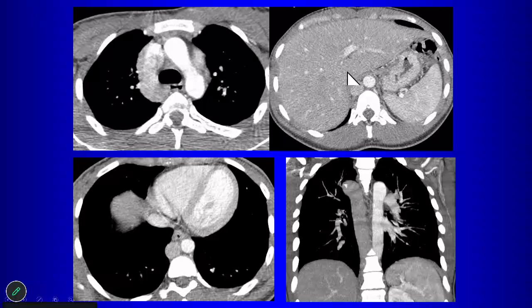So there's no intrahepatic inferior vena cava, right? So embryologically, this represents the azygos vein, which is carrying all of the blood flow from the lower part of the body, and that dilates, comes all the way up and drains to the superior vena cava. So if there's absence of the intrahepatic inferior vena cava, what happens to the hepatic veins? Where do they go? They find their way back to the.